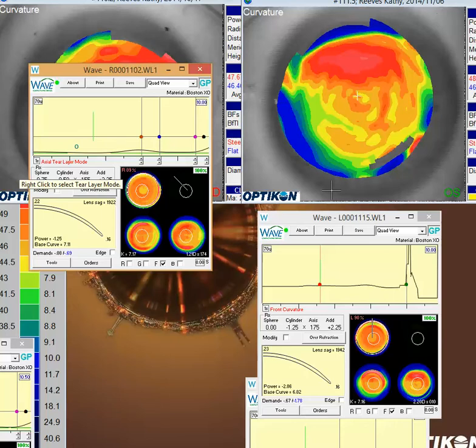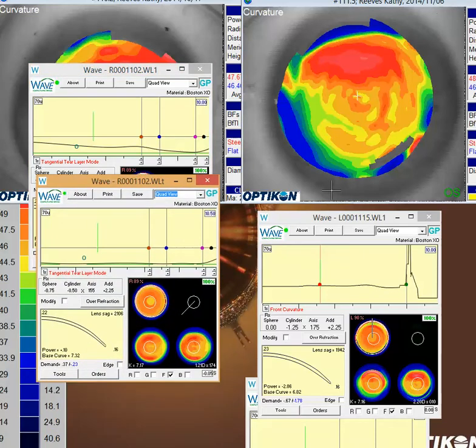So quite often I like to use a tangential design sometimes if we're concerned about lenses being kind of tight or looking a little too steep on the eye. So basically switch over here to tangential. I went a little larger, and I've mocked up a lens here just for a second.